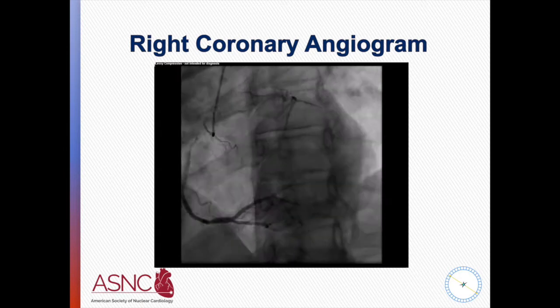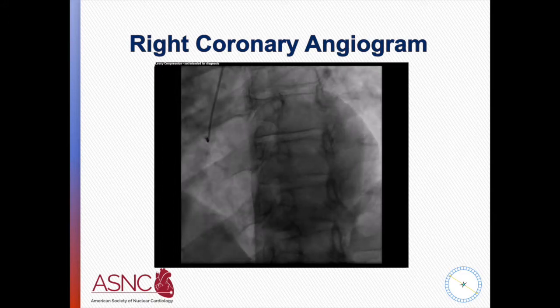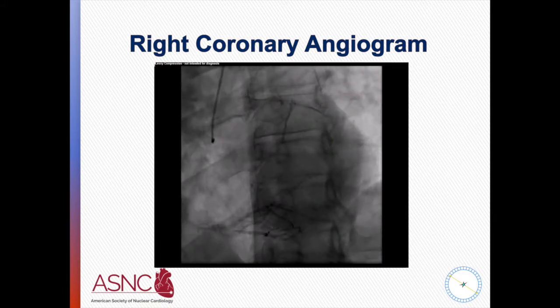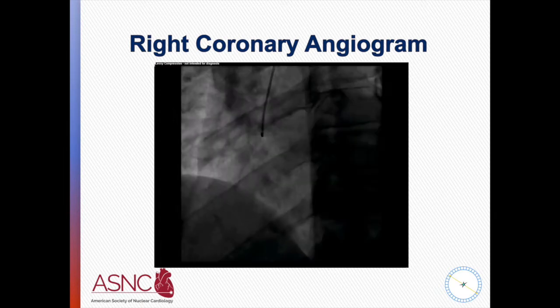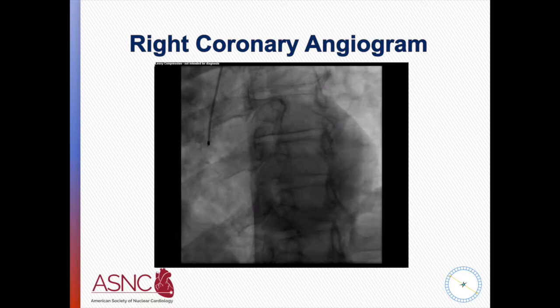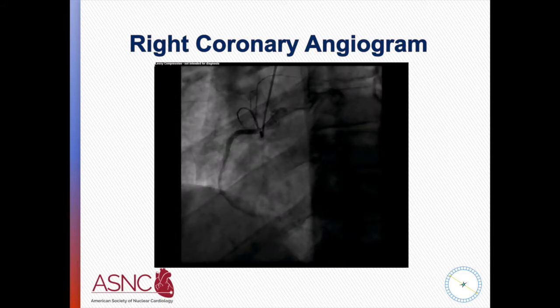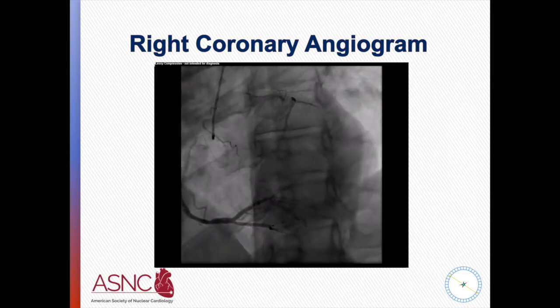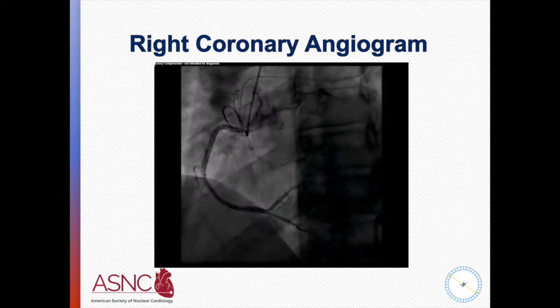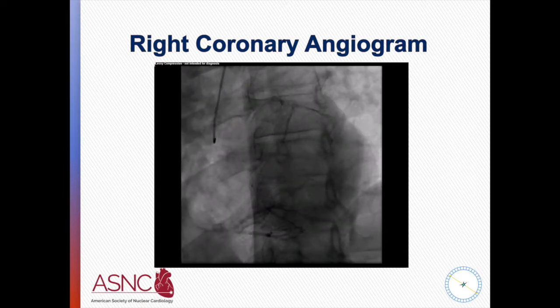So at this point in time, there was quite a bit of indecision as to whether or not this patient would benefit from myocardial revascularization based on his previous history and based on the findings of the invasive coronary angiogram. For these reasons, the decision was made to refer him for a viability assessment with cardiac PET.